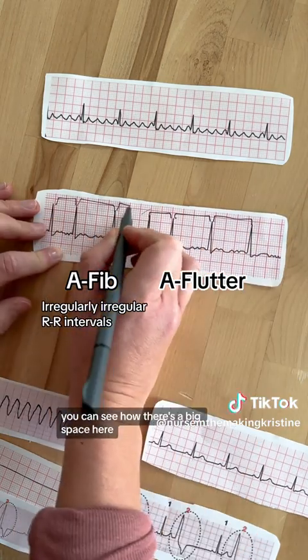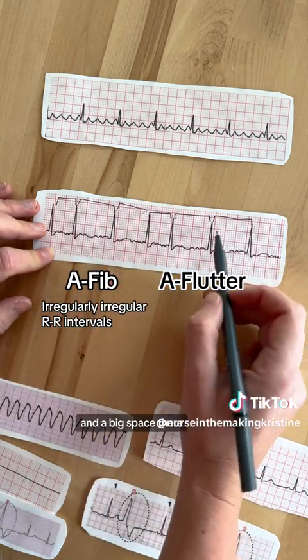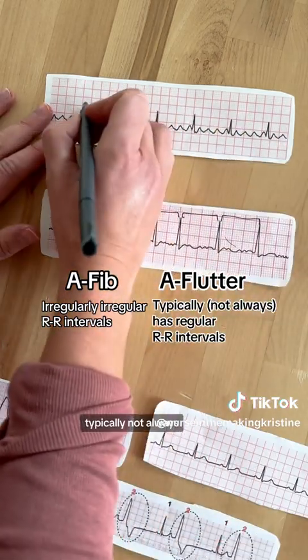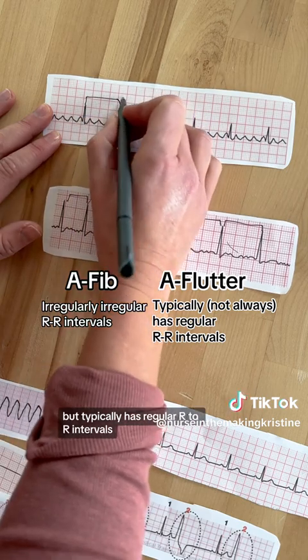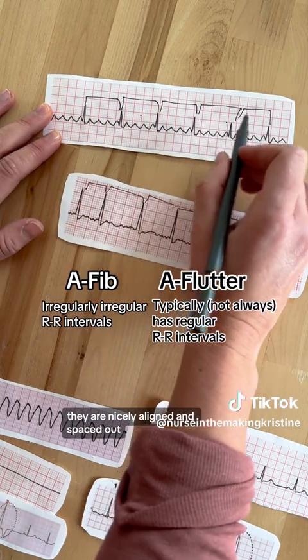You can see how there's a big space here, a small space here, a small space here, and a big space. They're irregular. Whereas atrial flutter typically, not always, but typically has regular R to R intervals. They are nicely aligned and spaced out.